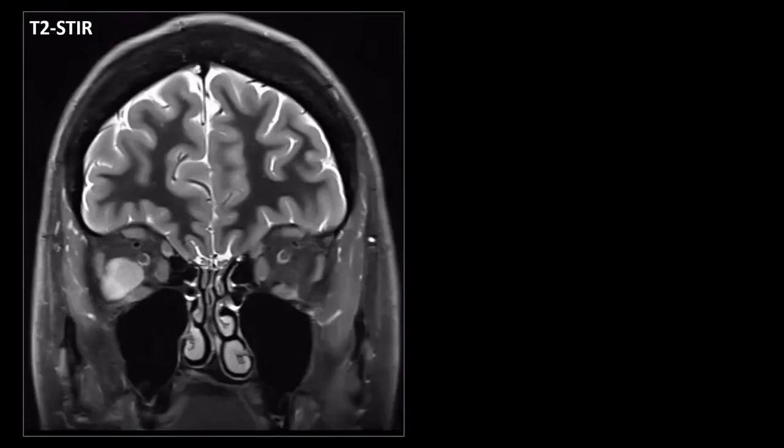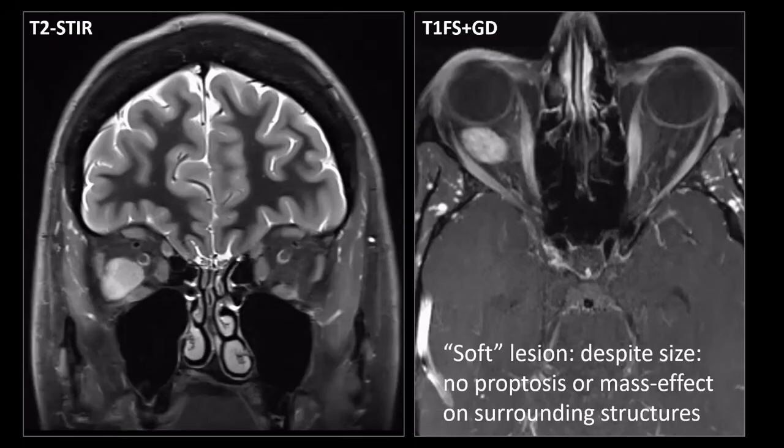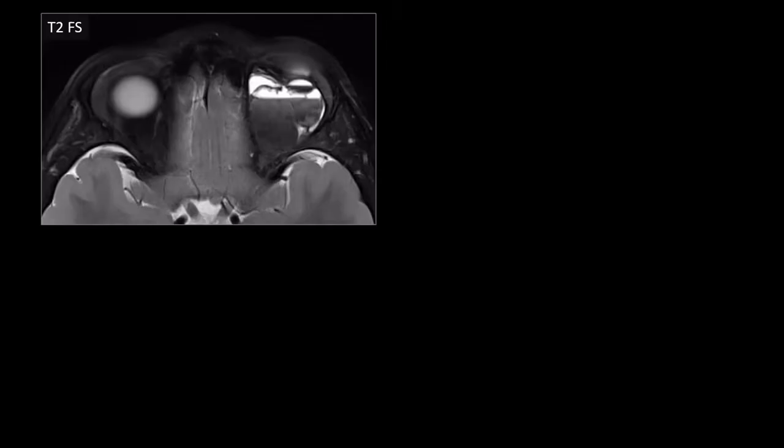What is also very typical for cavernous hemangiomas is that even if they are quite big, such as in this patient, they nevertheless cause no real mass effect because they are very soft lesions. And instead of pushing other orbital structures away, this lesion will basically adapt to the anatomy of the surrounding structures. So it will not really push them away, it will just crawl between them without causing a proptosis, without causing other pathology. So it's a soft lesion, and this is also very typical for a cavernous hemangioma.